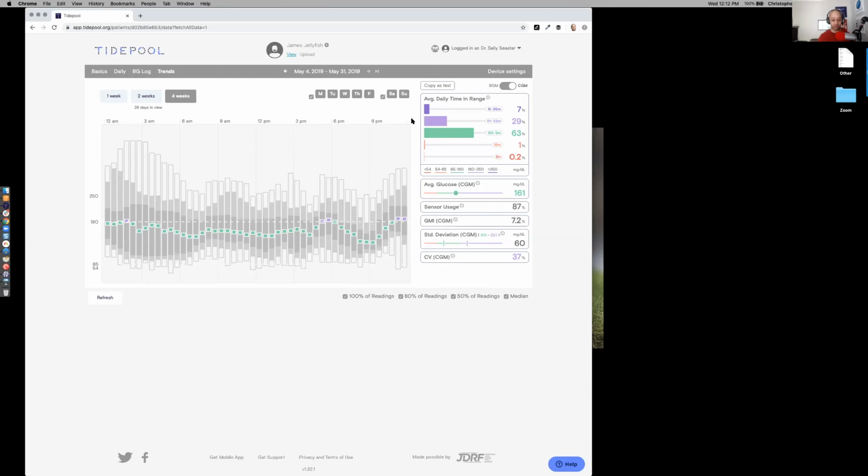So you can focus in on that 9 p.m. to midnight range, all around things you might be snacking, around your insulin pump settings, any other activities that you have going on there. Again, the trends view is a great way to identify at a glance where is an area of opportunity I can focus on to improve my diabetes management. Again, based off of your own goals and goals that you're setting with your care team.